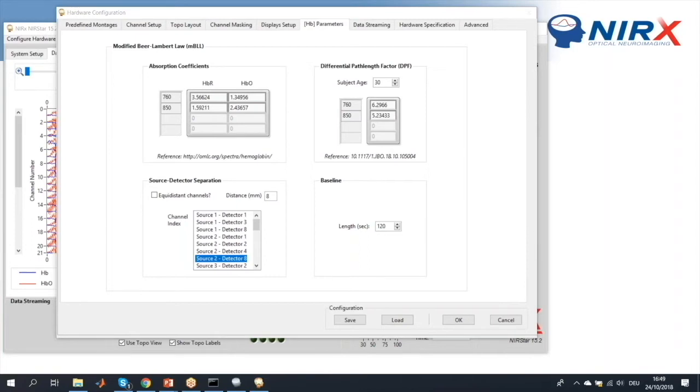Now we have springs of variable strengths. So if you want to do a measurement on the forehead, like Mahipal did, you will use the base of the spring-loaded holders, but you will not use the same spring tops as you would normally. You can use much softer springs, or as we call them, zero springs. And if I can add, we will have different levels of pressure, so to say. Yes, now it's different forces. It's from 0 to 3, with 0 being very soft. So for the most sensitive regions, up to 3, which is the strongest spring.